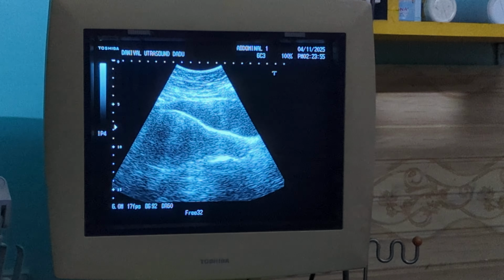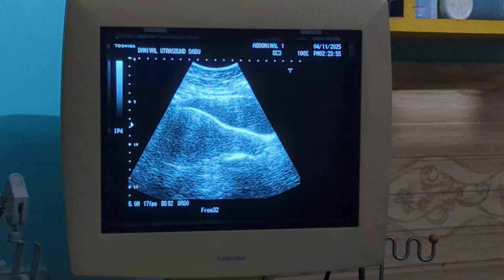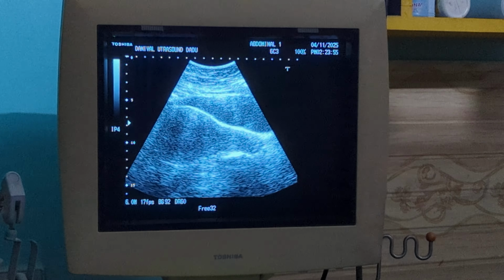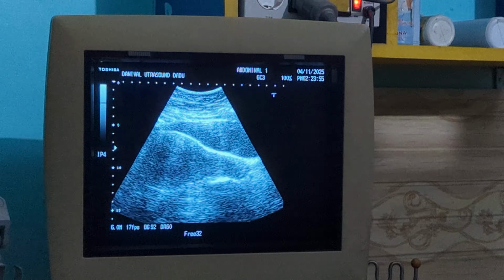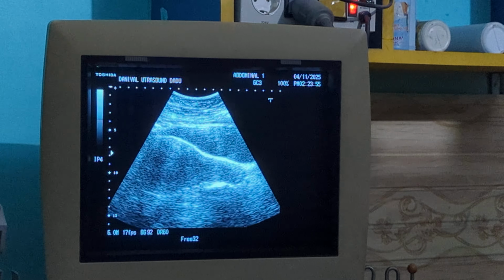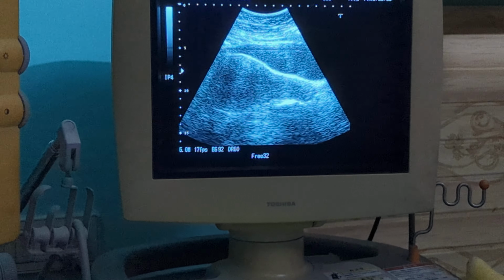Sometimes you can see a Venetian blind or striped shadowing pattern on the posterior wall. This is another suggestive sign, but it is not shown here. In many cases there is asymmetrical thickening, more commonly when the posterior myometrial wall is involved. But here it is a diffuse enlargement, diffuse involvement, so it is a symmetrical shape.